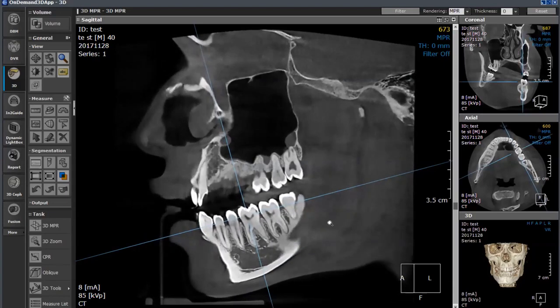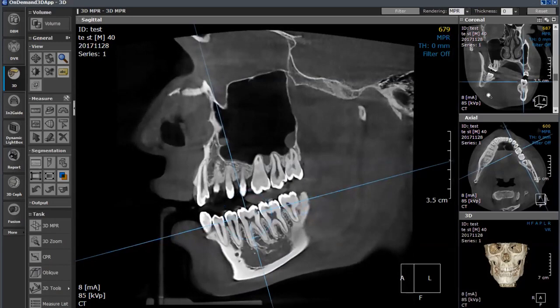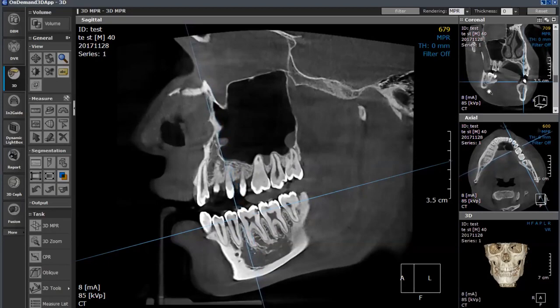Now, a number of you know who I am, and I came from orthopedics, and our rule was essentially one view means no views. So being able to take this and look at it from a different perspective and be able to look at it from mesial distal. So you can see I'm moving my mouse up to the top and moving over because I want to be able to evaluate that first tooth there for if that's a cavity or not.